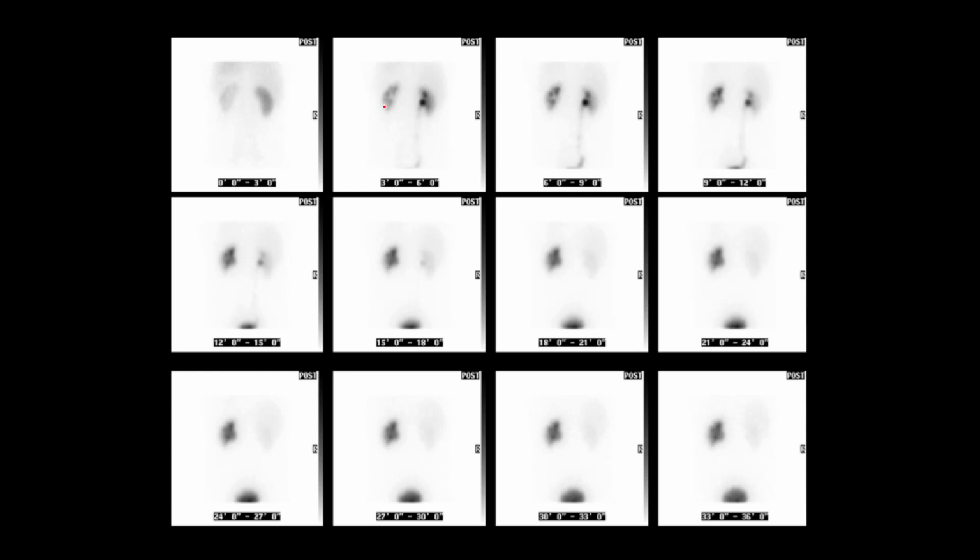So here you can see that the activity is accumulating within this prominent pelvic calyceal system on the left over time, and really there's not an awful lot of clearance taking place. It just gets grayer and grayer and blacker, and there's not much clearing, as we have seen in the previous examples, while on the right hand side, this kidney here, although it develops a very black renal pelvis, it quickly clears down the ureter into the bladder. So this kidney on the right is having no difficulty clearing. This one on the left is just accumulating tracer, and therefore we're just getting blacker and blacker all the way along.